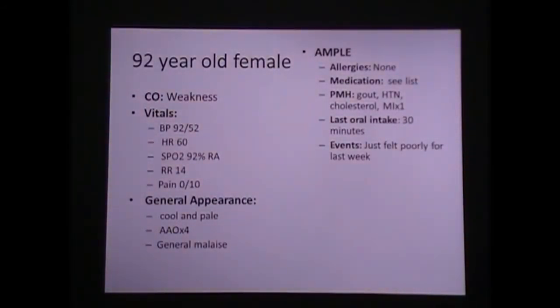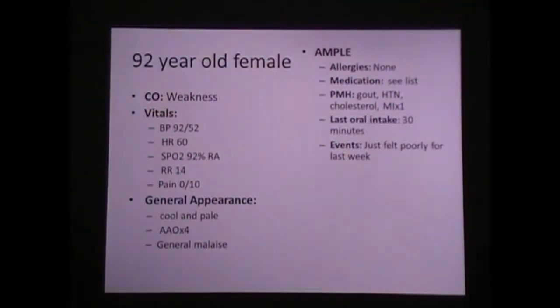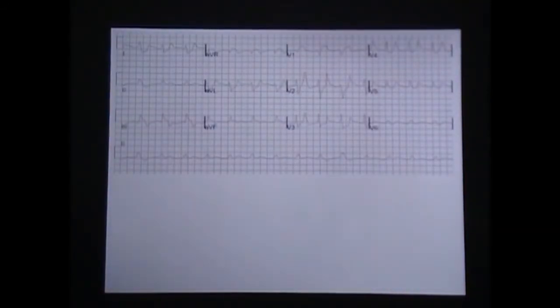Boy, it looks really familiar. Okay. So Phil's poorly for a week. Okay, so here's your EKG. What's your first general impression?